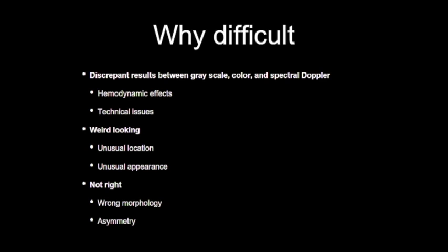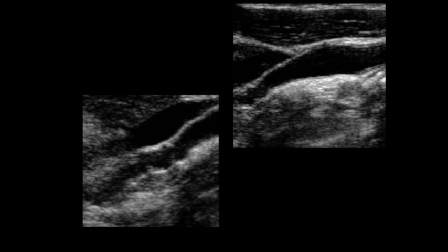And so I've been asked to talk about difficult cases, so let's go and show some difficult cases. Here's a list of what makes things difficult, and you're going to see examples of all these as we go through. So I'm not going to try to tell you. So let's start with the case of the late stenosis, okay?